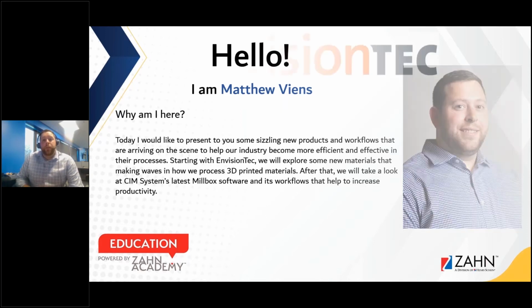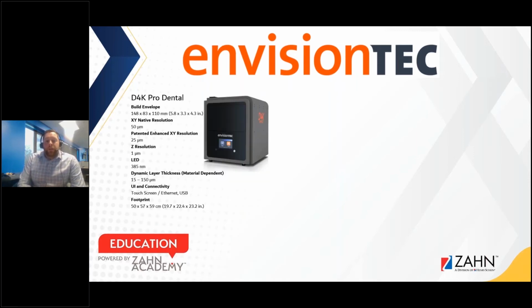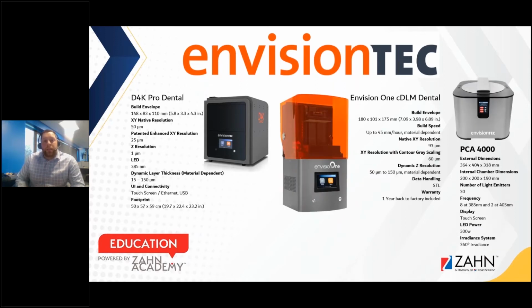Okay, with that, let's touch on the first aspect, which is going to be EnvisionTEC. EnvisionTEC has a number of printers being brought into the dental field, specifically the D4K and the EnvisionOne printers. Along with that, they're also going to provide a light curing unit, the PCA 4000 that you see here on the screen. The difference between the D4K and the EnvisionOne is really going to be the cost and the build platform size, but they're both really well developed printers that allow us to print at a very fast and accurate rate.